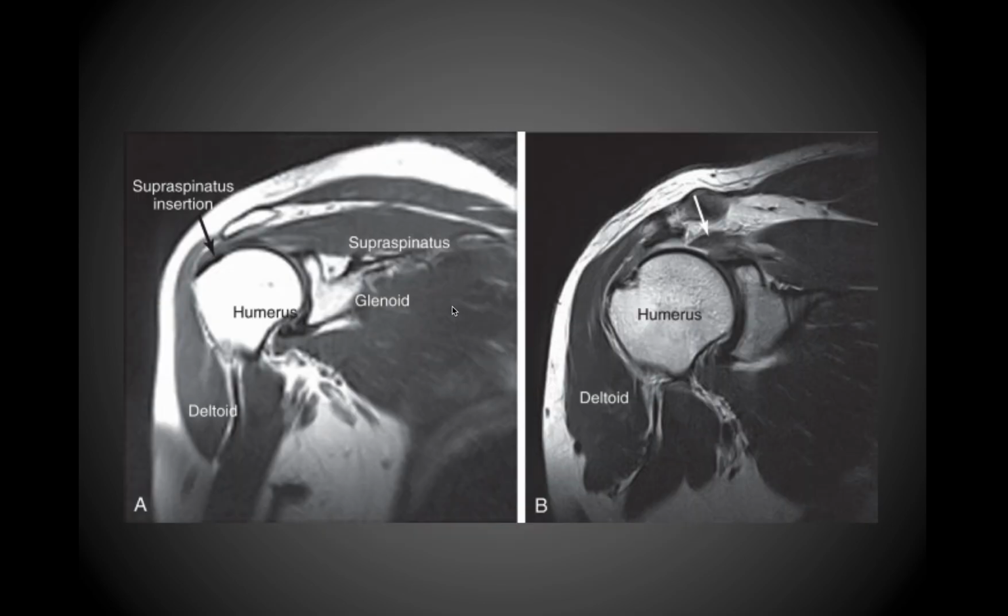And so now we're going to look at some MRI and ultrasound images of the shoulder. So these are common techniques that are used to assess the soft tissues related to the shoulder. And so hopefully everyone remembers the rotator cuff provides tendinous reinforcement or stability to the shoulder joint. So this is really important because of the fact that the humerus does not sit deep within the glenoid cavity, and so you really need the tendons of the rotator cuff muscles to reinforce the shoulder joint.